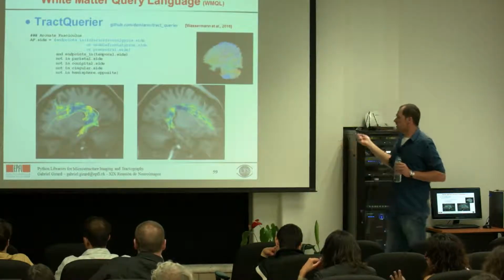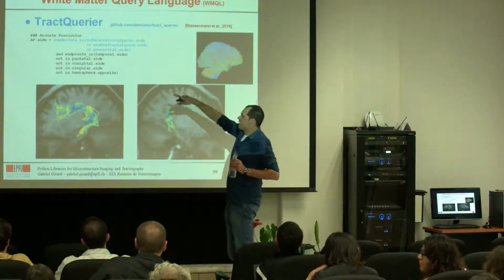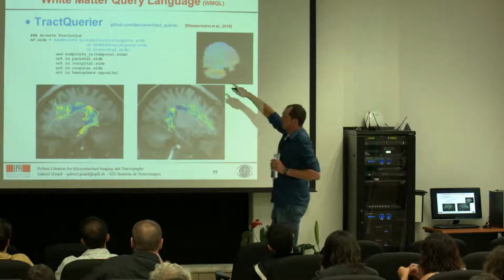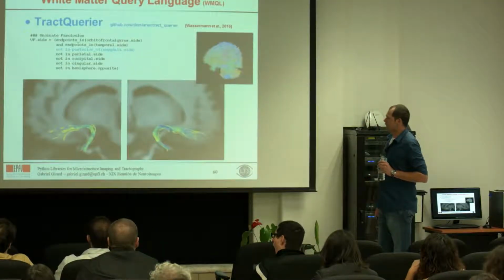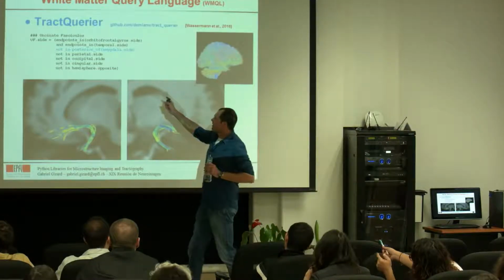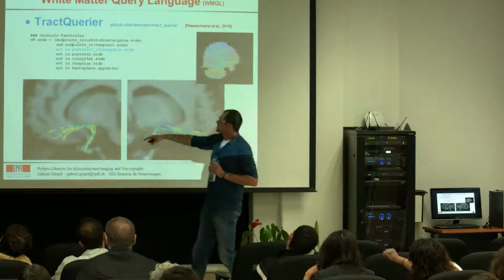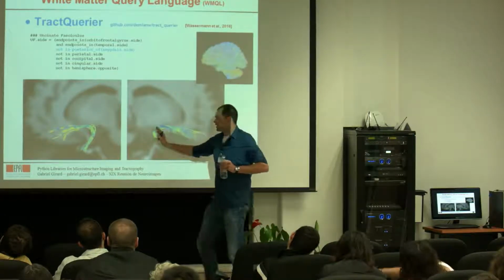So if you want to define the arcuate fasciculus, you might want the streamline endpoints in those labels, and again, you define some kind of constraint on the fascicle. Or you could, for instance, here, we want streamlines that end in the orbitofrontal gyrus, end in the temporal lobe, but also don't go posterior of the amygdala.